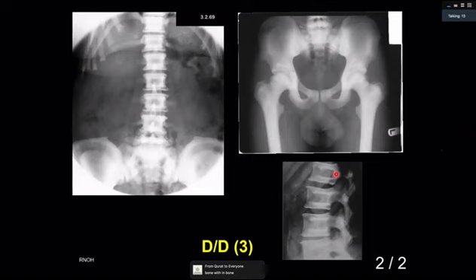All right. Basically, this is osteopetrosis, and why is it osteopetrosis? Please remember that osteopetrosis is what we call the sclerotic bony dysplasia of most significant magnitude. And osteopetrosis has got a cyclic type of pattern.